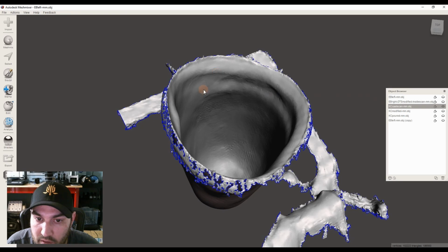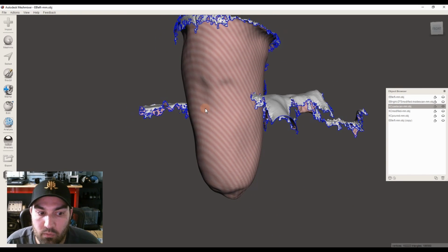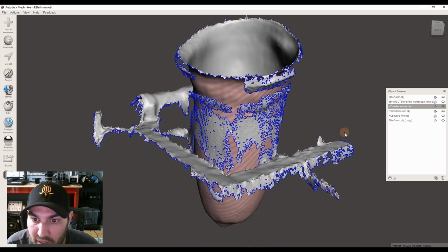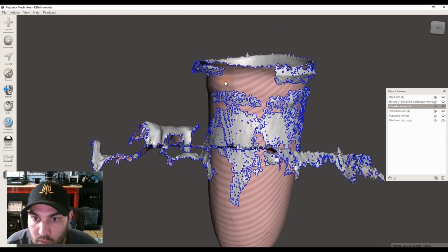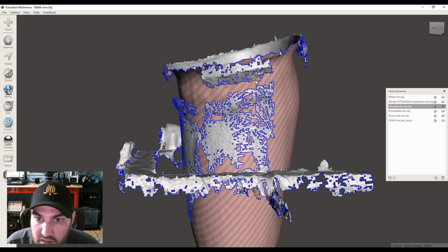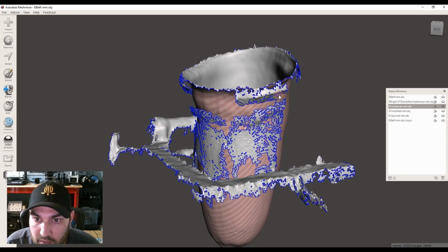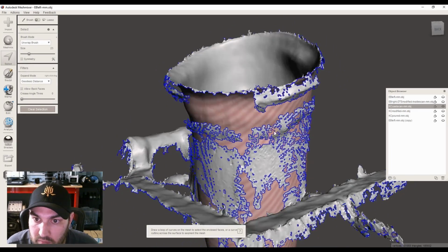we scan the inside, we've got our pink and white stripes on the outside, and we actually need to get that turned inside out so we can work on it. But first we want to get rid of all of this extra stuff. So in this case, you can see we don't have anything connecting. So these are actually going to be two separate groups. If these, let's say these were connecting right here, that would all be one set. We would just have to kind of select out and delete some of that to break that connection.